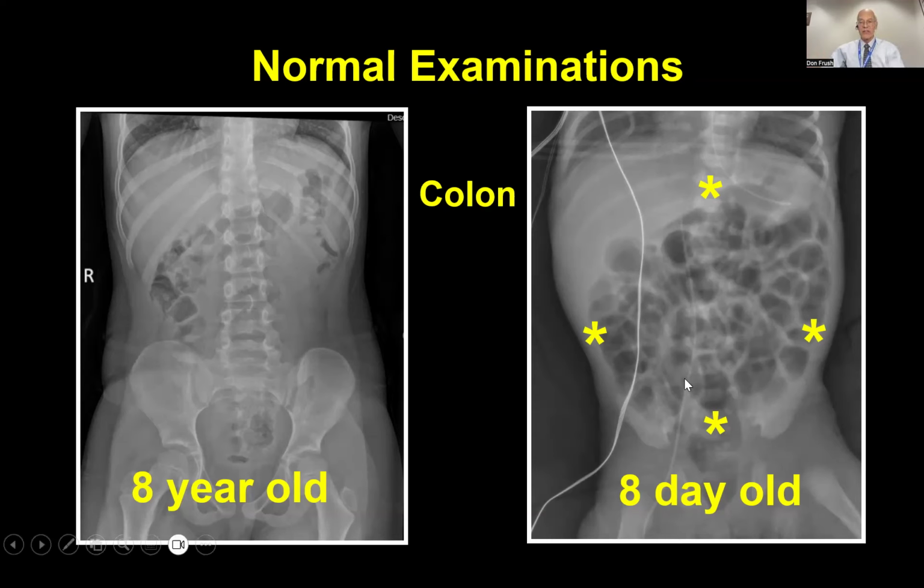So basically, what you can do for a rule of thumb, or when is a bowel segment potentially dilated, is look at the interpedicular distance at about L4 here. And that's a good scale, particularly the first year. If it's bigger than that, you have to consider that the bowel's dilated. If the caliber of the bowel you see, and this is a normal caliber here, is less than that interpedicular distance at the lower lumbar spine, then it's probably okay.